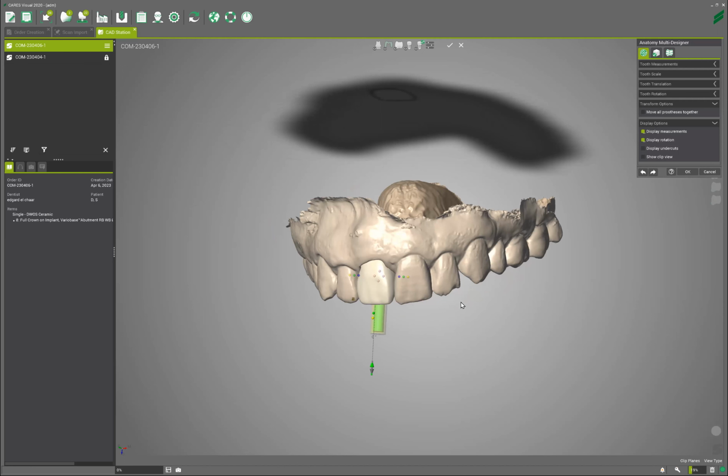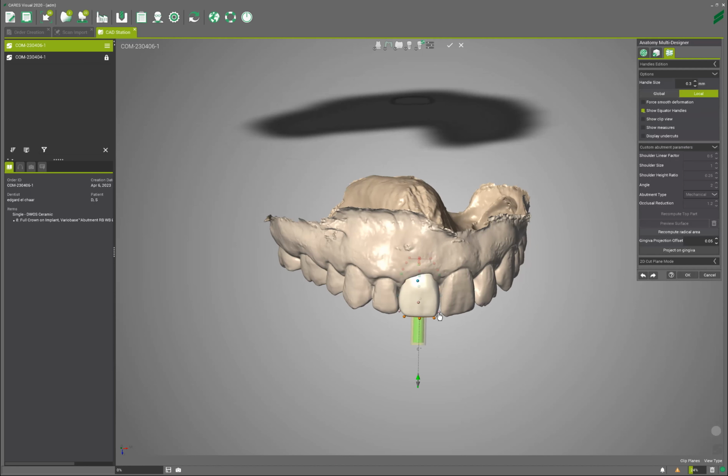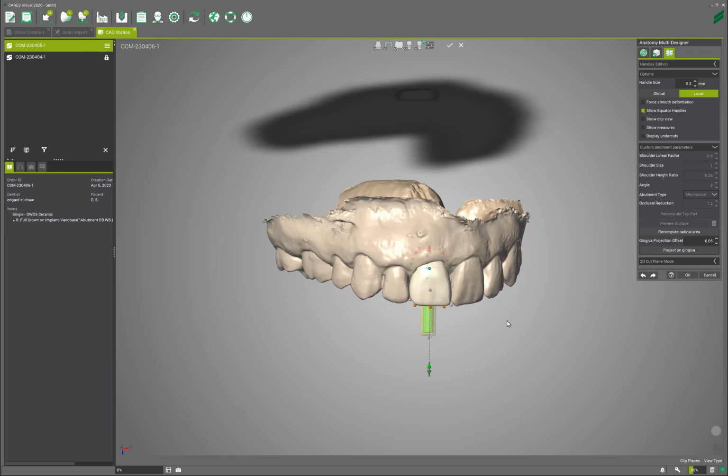But so what I do is now I go to these points. And now I made it a little bit like that. Okay.